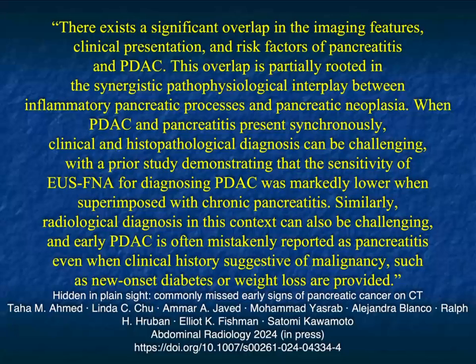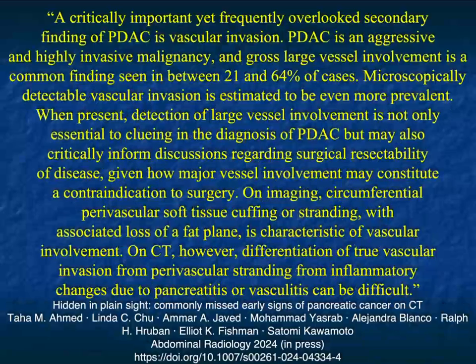Sometimes patients with pancreatitis can be hiding a pancreatic cancer. We know the rule is if there's no good reasons for pancreatitis and you see a dilated duct, you better wonder if the reason the patient has pancreatitis is secondary to a small tumor that's going to be in place. So again, there are a lot of things we know, but this title of the paper, Hidden in Plain Sight, is a very good way of thinking about things that in retrospect, sometimes we will see the lesion. Now, I have to admit, sometimes even knowing where it is, I can't see it. That's where a lot of the work that's going on with radiomics may prove to indeed be very, very helpful.